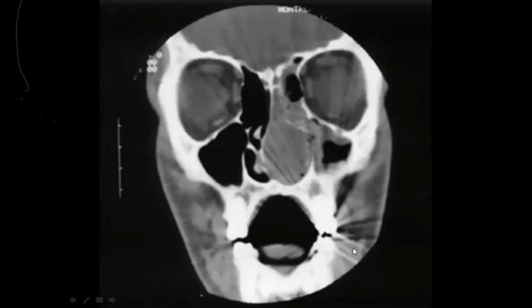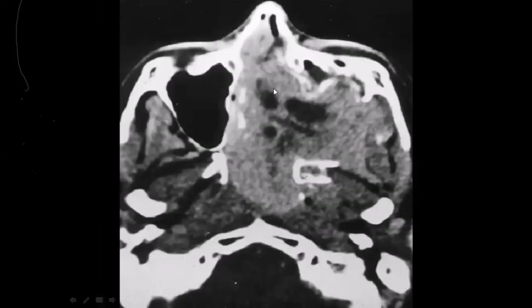Something in the nasal fossa, and in this nasal fossa, you can see that it's obliterating the maxillary antrum pathway, and there is also extension to the ethmoidal, and you see this soft tissue. First thing that you think about is the type of patient. This type of patient is very, very important in the exam: if you see something in the sinus, don't forget to ask, is it a boy? It is young. So it can be something enhancing, hypervascular, exactly.